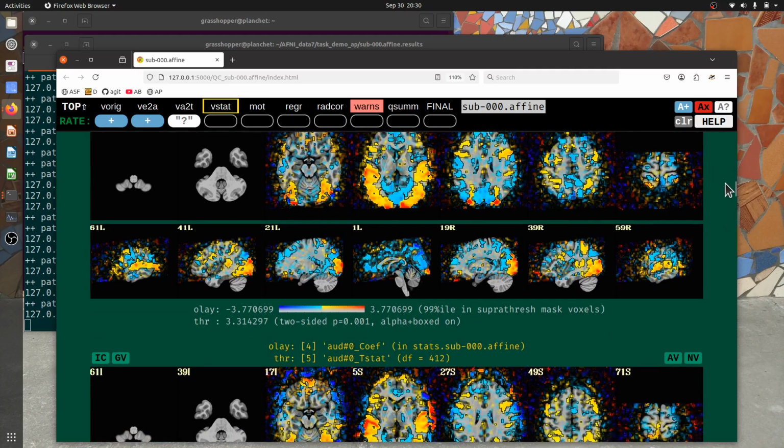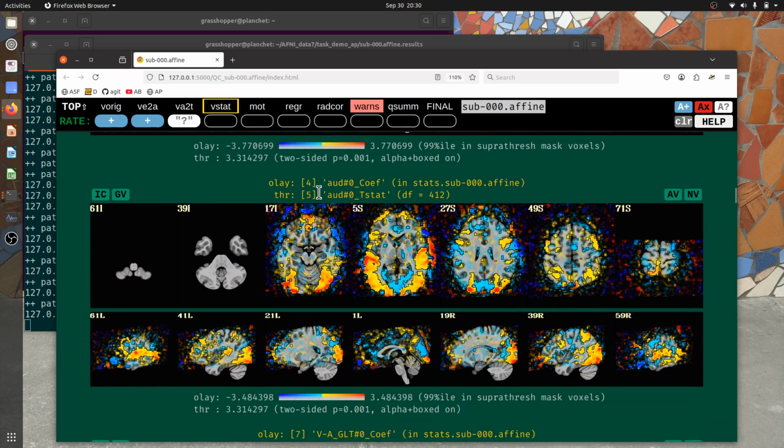All right. And then as we keep going here, the second stimulus that we had in our afni_proc command was the audio one. So now we see the response for the audio task and the same style of presentation of results: transparent thresholding, displaying the effect estimate as the overlay coloration. So this is plus 3%, let's say, and this thresholding is based on the statistic with two-sided testing, because that's what we pretty much always have as our hypotheses of interest, is something different than zero.